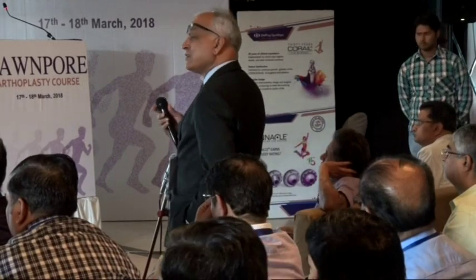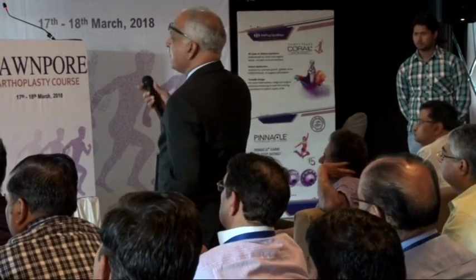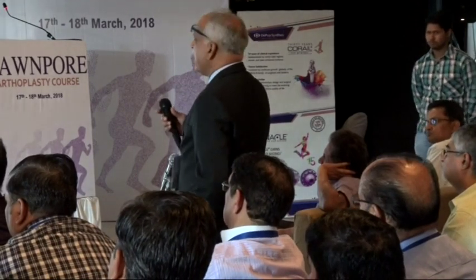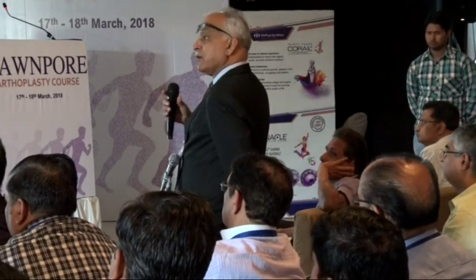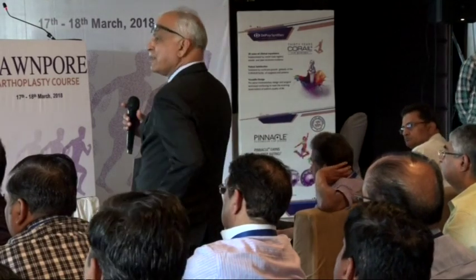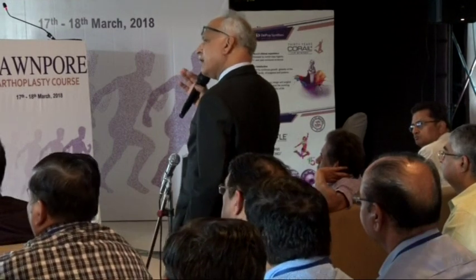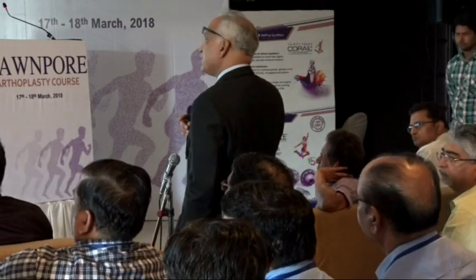On the right side, the surgeon was not comfortable. You can see from the cut, the distal femoral cut, the way he tried to build up the medial condyle. You can't build up like this. And the rod is also hanging in the air actually. I'm quite surprised that the medial unit has not become loose as yet. So I don't think there was a technical understanding problem here, and the surgeon did not expect it.